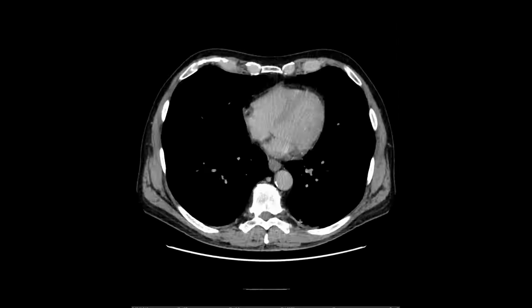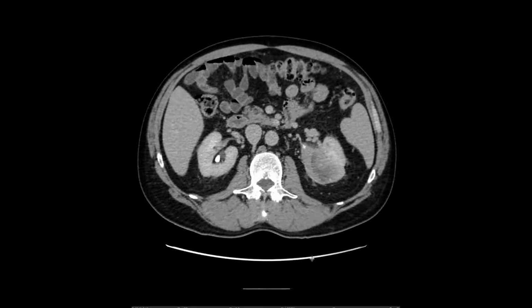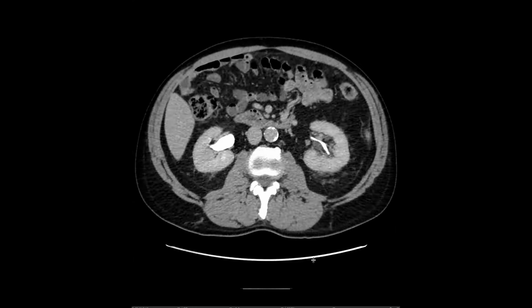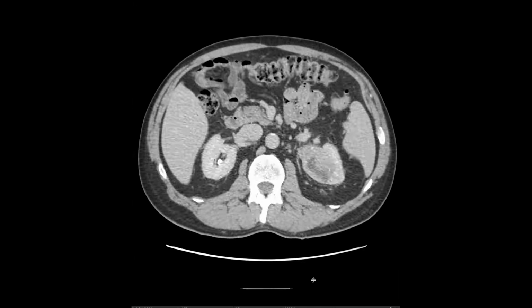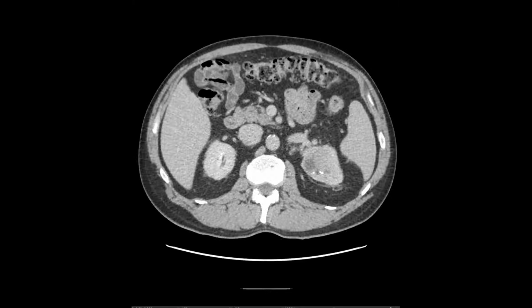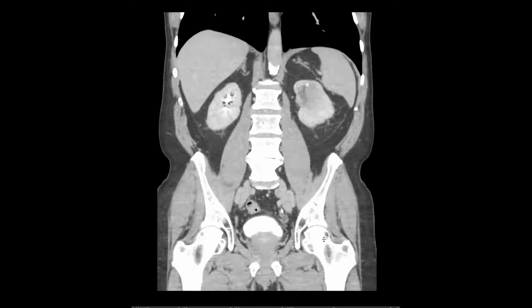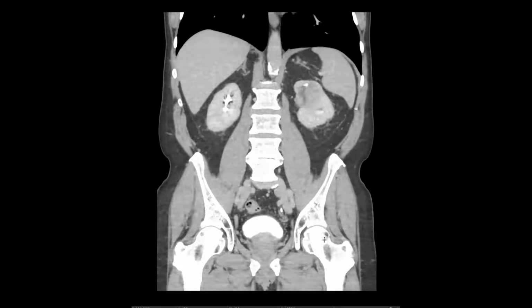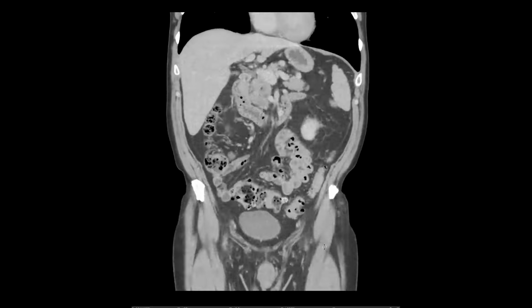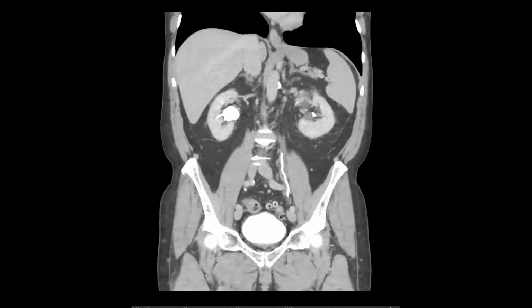And what are you going to recommend? Infiltrative. Like we always say, ball versus bean. Is it an RCC, like a ball, or is it infiltrative, like a bean? And I'm wondering if it's an infiltrative mass of a duplicated system. Okay, so therefore leaning towards urothelial. Good, excellent. So that's what it was.